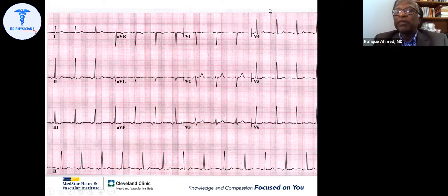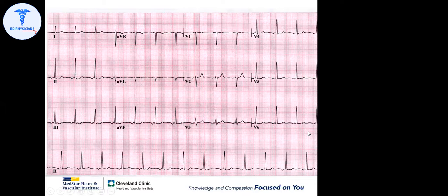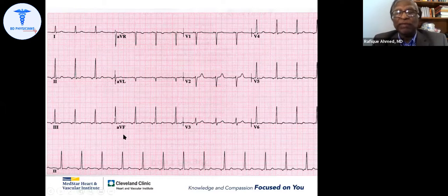How many participants have we got today? Sir. How many? 30 জন আছেন। Anybody wants to answer? Anybody wants to answer this ECG?